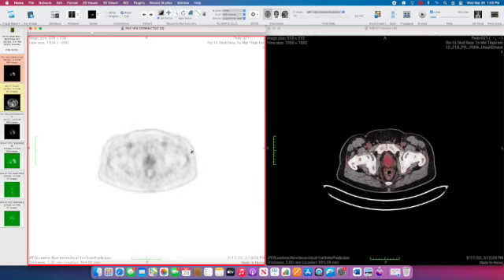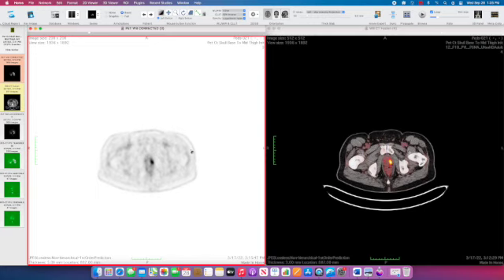here this is the level of the prostate. The upper portion of the prostate, which is the base, looks fairly normal, but as we go more inferiorly, this is actually the apex of the prostate, we see a focus of intense radiotracer activity in the left prostate. So this is that prostate-specific membrane antigen. This is the original site of the patient's prostate cancer.